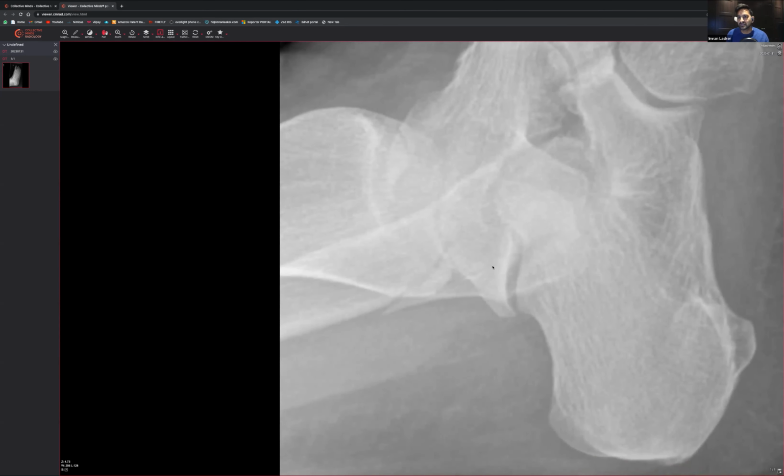When you come up to here, can you see that? Hopefully people can see. There actually is this hidden little guy sitting over here, pretending to be all good, but actually it's not all good, is it? There looks like there's a fracture over there, doesn't it? That doesn't look quite right. And you can almost draw the fibula going around like so. But you almost feel like there is also radiolucency over here as well. So you'd be worried that there could be a bigger fracture.